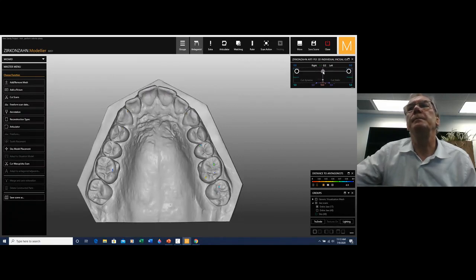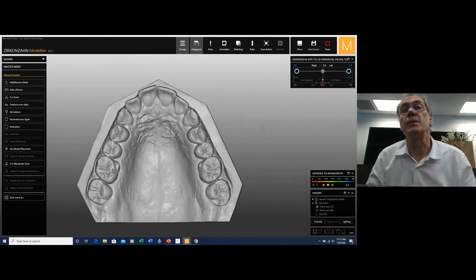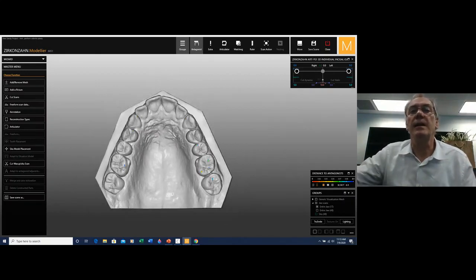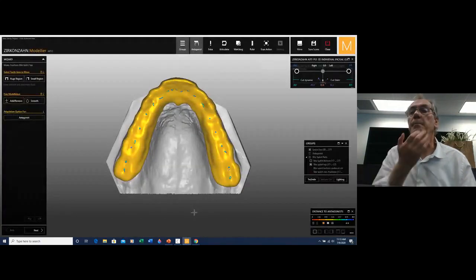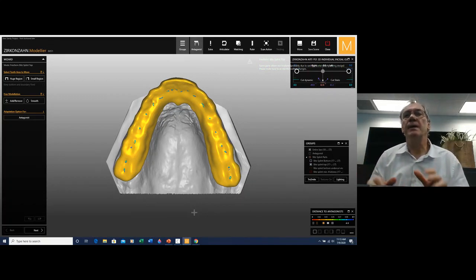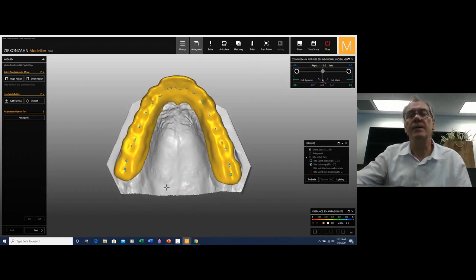But in the meantime, what we are going to do is perform some odontoplasty and give the patient at least 6 months of time of assessment to see that whatever we have done is done correctly. And in order to do that, we are going to set up a bite. I'm not going to go through the actual procedure of creating the bite, but I'm bringing you to the final point on how I would like my bite to look like.